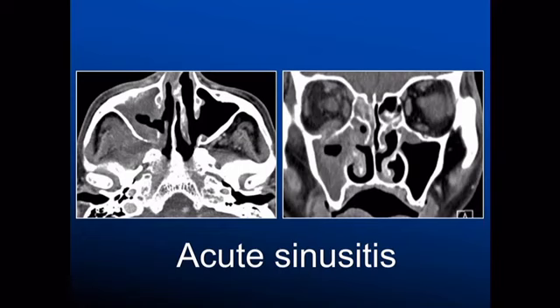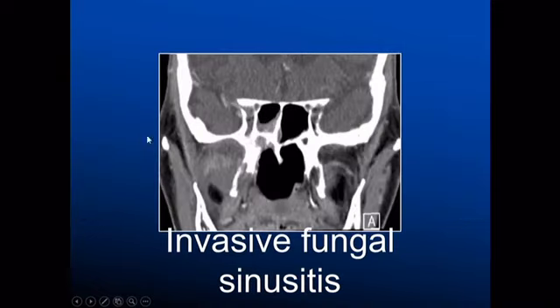This is one of the last couple of cases. This is a patient in hospital with acute sinusitis. This one's not too hard to spot, but you can see in the retromaxillary fat on the other side, we've completely lost all of that retromaxillary fat, and this was another case of invasive fungal sinusitis. You can see here in the region of the infratemporal fossa, the fat is completely lost. So that's another key sign to look for, particularly for invasive fungal disease.